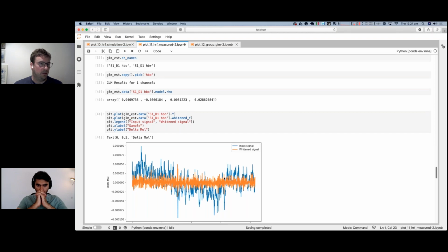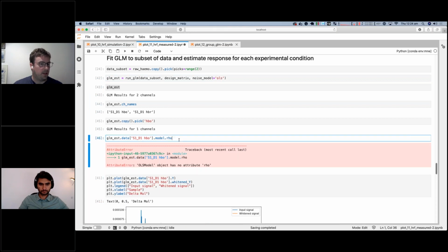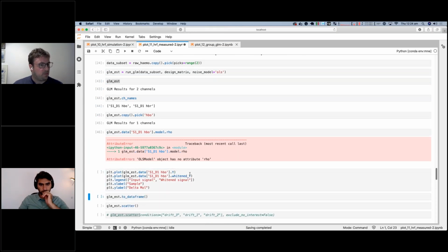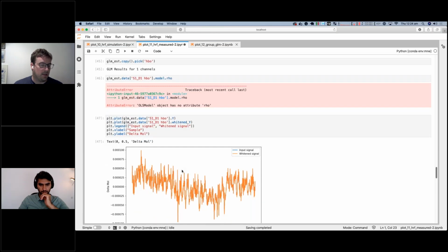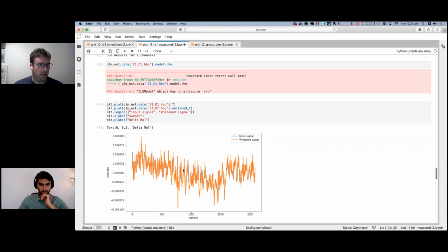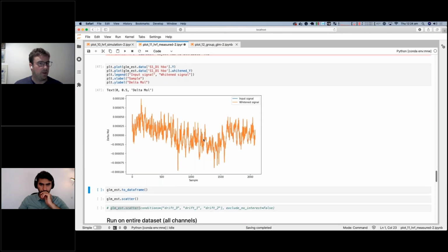Whereas if you did an ordinary least squares fit, there's been no autoregressive fit here. So that's how you do the autoregressive fits. That's all quite advanced. I think what most people would use is the convenient functions that we've laid on top.